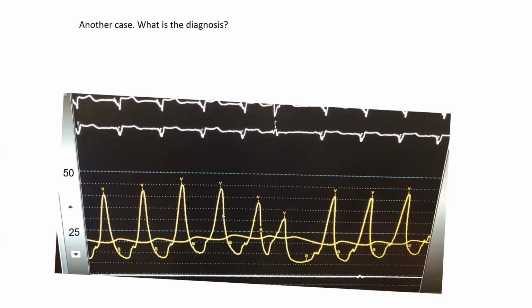This patient had severe heart failure. He did not have severe MR. When you have such a large V wave, the A wave becomes diminutive. Typically in those cases, the atrium is dysfunctional. They have either severe MR, decompensated, or severe heart failure. So the atrial function is impaired and the atrium doesn't contract much.